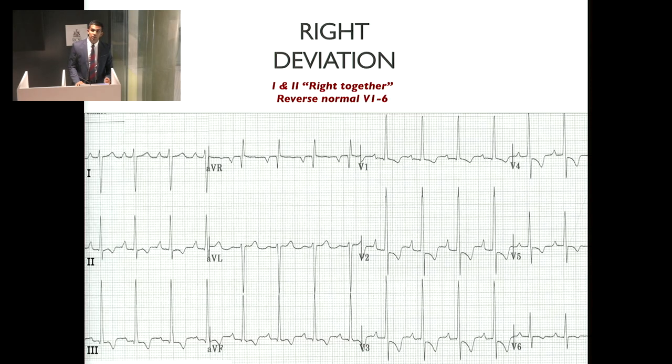Our last ECG depicts right axis deviation, which can be caused by, say for example, a thicker right ventricle in right ventricular hypertrophy, or a thinner left ventricle in left ventricular infarct. We split up our ECG.